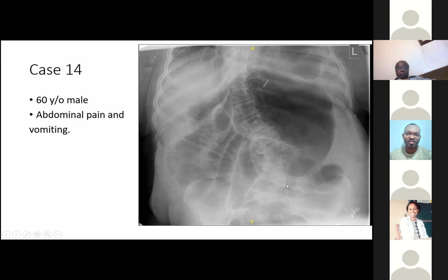So statistically you can work out what it is, but by just looking at it, it's difficult to say. You can see some haustra, which gives the clue that this is large bowel, but you can't actually tell that it's cecum. It's the other clues that point to cecum, more than just looking at this alone.